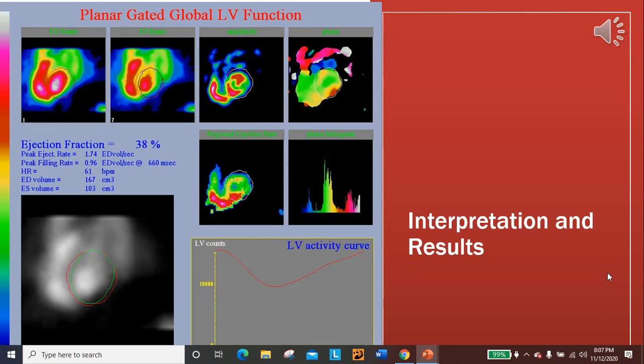This shows the results for the left ventricle function. On the bottom left, it provides the LAO image with the region of interest that is automatic. On this one, it showed up automatically fine. We didn't really need to adjust anything on there. It's perfectly surrounding the left ventricle.